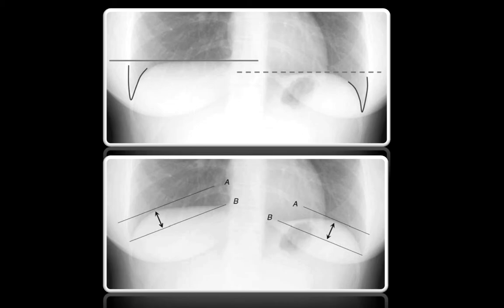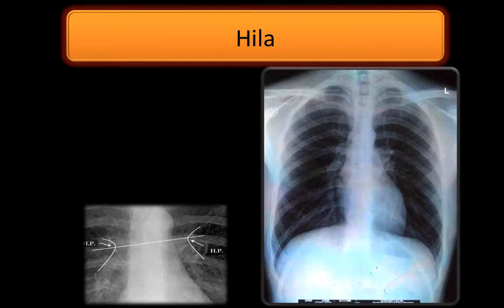And if it is more, then we can say there is some muscular weakening or humping or some kind of hernia or maybe something else. So that's quite important. I think you shouldn't need to measure them. Just look at the X-ray and you can imagine what's going on.